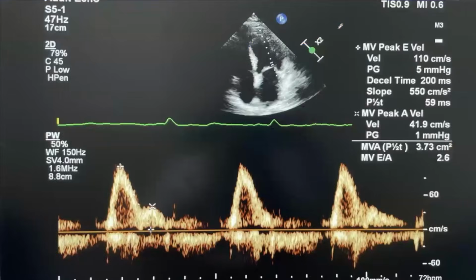We talked about this one already. So what do you think about this one? This is cases now. Done with the talking. There is no talk. Any idea? No, they wrote this one E, and this is A. Yeah. Do you think it's correct or not? And why?